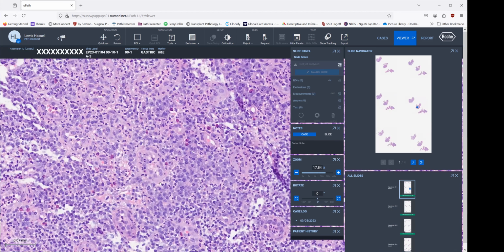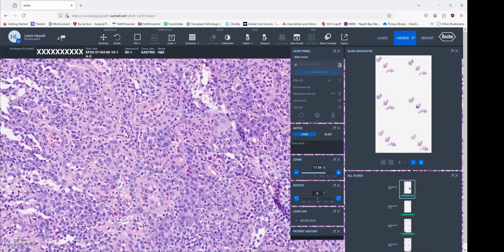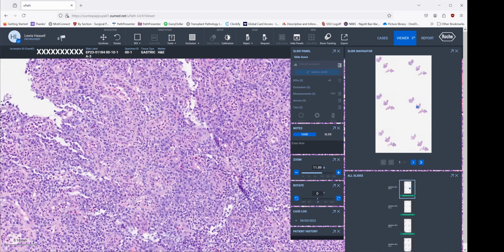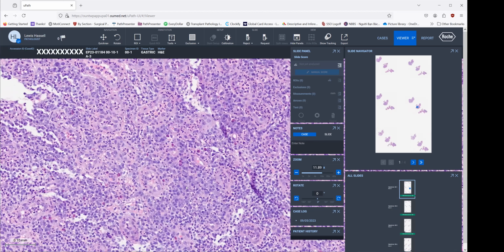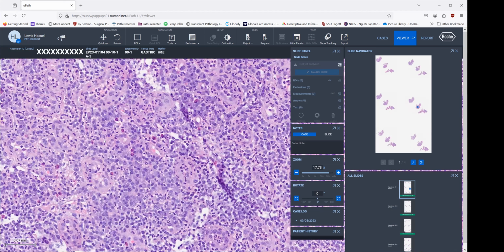I often find that the new trainees have difficulty is that they see a tissue like this from a gastric biopsy. And that's actually, I think, the reason I flagged it, because in reviewing this case with my resident, they were convinced that this was carcinoma. Well, a couple of things would make you think twice about that. One is the age of the patient, certainly at 19, does not look likely to be related to carcinoma. Secondly, we see here we've got lots of plasma cells, some eosinophils. And so the plasma cells are certainly not malignant.